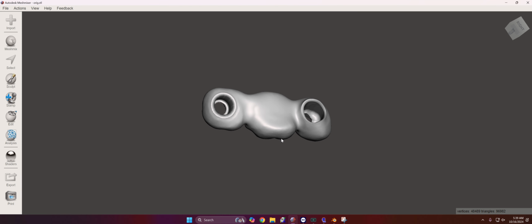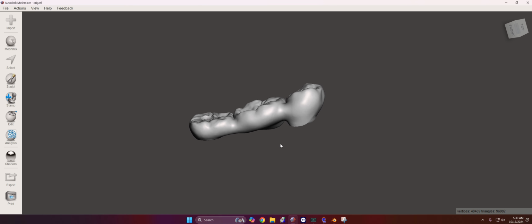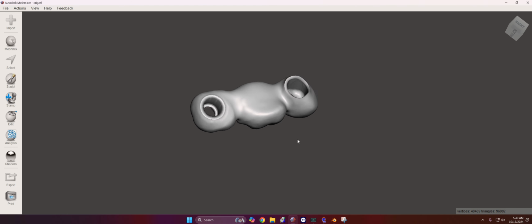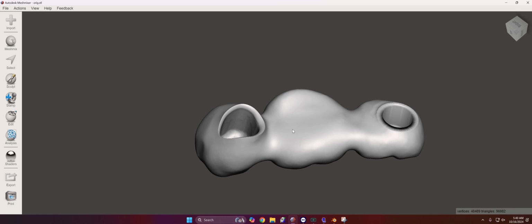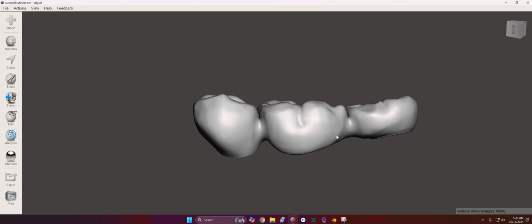So this is a case that was designed up. It's a little tiny bridge, and we have some limited occlusal room here, and there was a multi-unit abutment back here and a regular custom abutment. Well, what I saw once we started and got this thing designed and we sent off this abutment is that it really is not going to be supported for zirconia here.